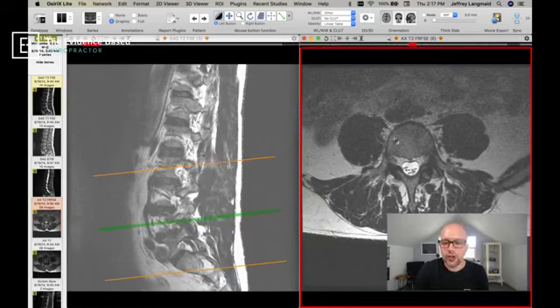This is what I'm circling right here on the right-hand side of the screen. This is muscle on the backside, muscle on the backside. This is the spinous process. And this big white space is the central canal or spinal cord. This is actually the thecal sac. All of those little black ants, as I call them, those are the individual nerve roots that are traveling down. So that is the lay of the land.